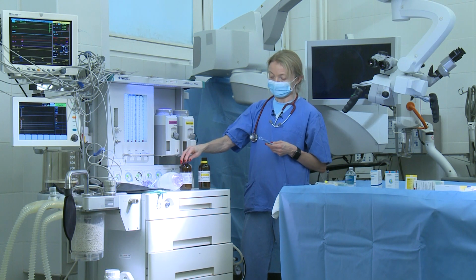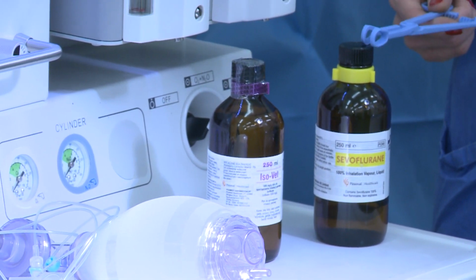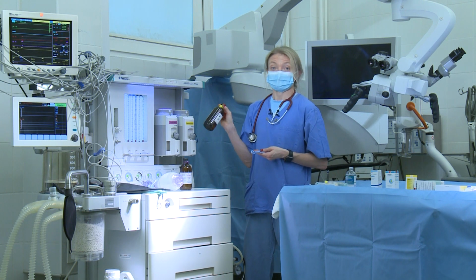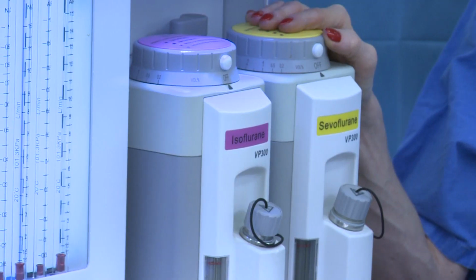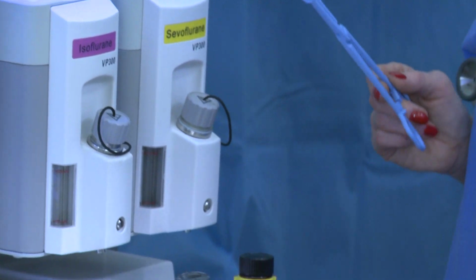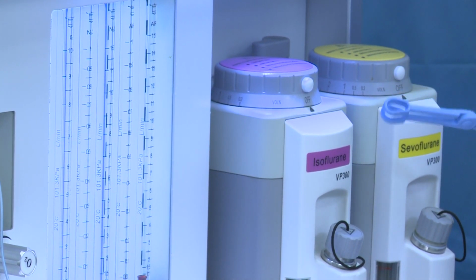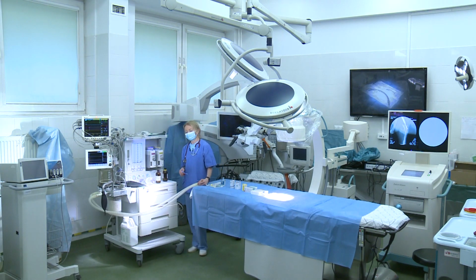The most widely and commonly used anesthetics on the veterinary market now are two: isoflurane and sevoflurane. But you can tell me, okay, you are talking about the gases, and here we have a fluid. So that is why this is the magic place, where all the magic happens. These are the vaporizers. Inside the vaporizers, we put the anesthetic fluid, it vaporizes, and the fresh gas flow catches the anesthetic fumes and carries them to the airway and to the lungs of our patients.